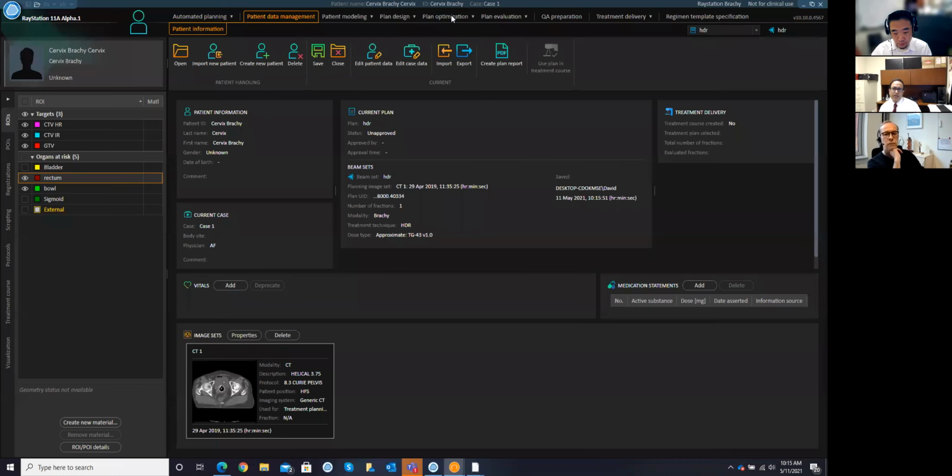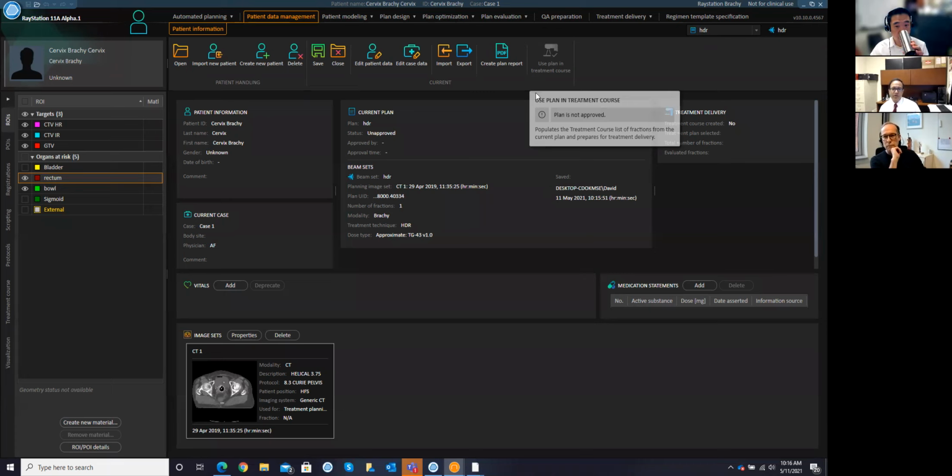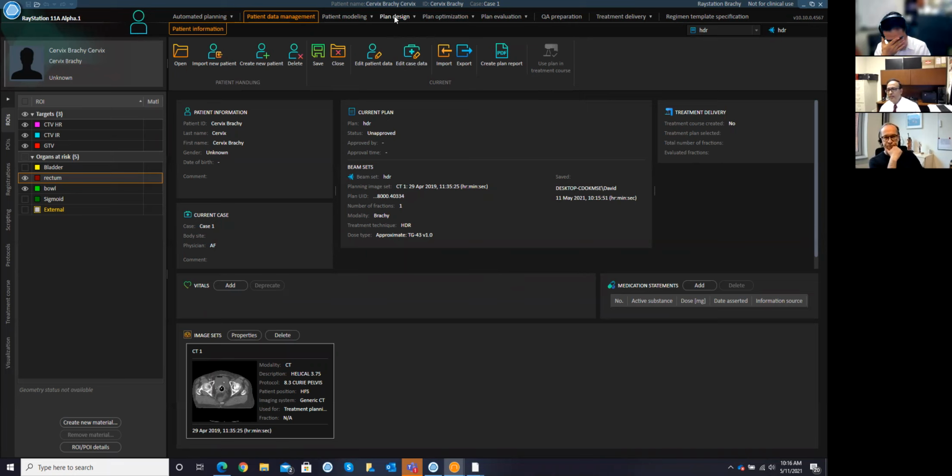Another thing is that like with LINAC, when you do external beam, we transfer the plan to the record and verify system, for example, ARIA or Mosaic. Is the HDR part also integrated through those types of record and verify systems, or does it just send the plan to the treatment delivery unit and treat there and record it manually? So far we have only done the direct import to the afterloader. We are discussing how to integrate through our own OIS, RayCare, for the future.